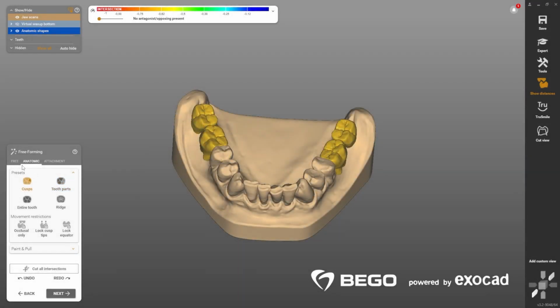The teeth do not need to be reduced from the basal side. This is done later in the Partial CAD app design. Only the approximal and occlusal contacts should be adjusted.